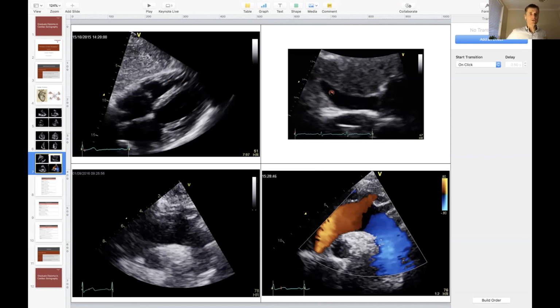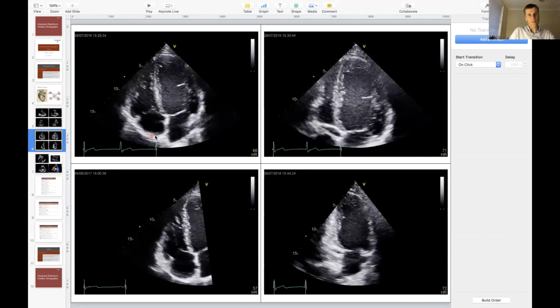The last thing I wanted to point out to you for this anatomy tutorial was that one of the features of the heart that's very obvious from multiple views is the pericardium, and perhaps one of the best views to see the pericardium from is the subcostal view. You can see this very distinctly bright echoes coming from the pericardium here, and you can see it adjacent to the lateral wall of the left ventricle as well. You can see the pericardium from other views as well. You see it particularly clearly here, superior to the atria. You can see it down here at the apex of the heart.